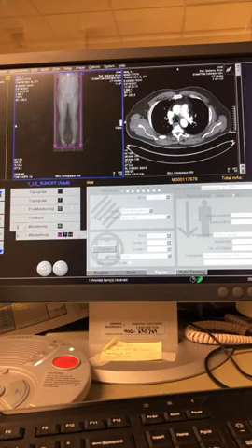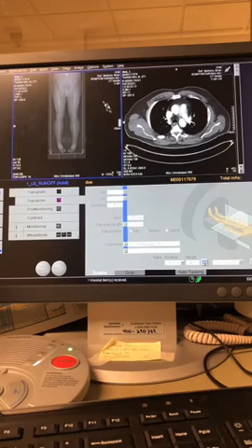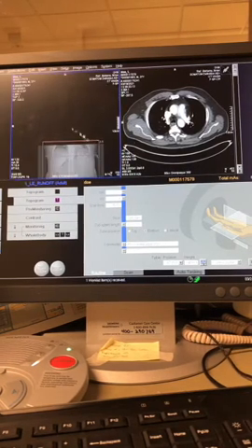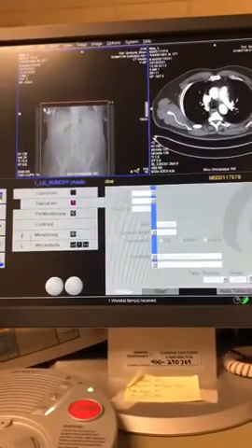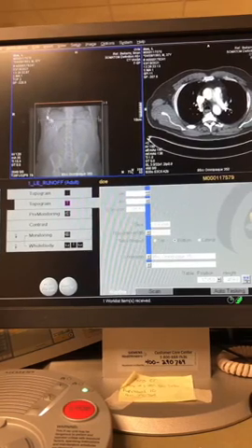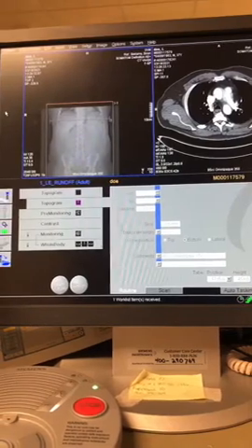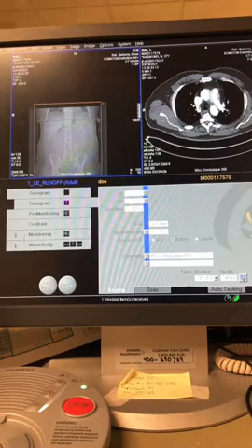All right, so again, we'll start at the top of the topogram. Now this topogram is wrong, but we'll still start there, okay? Like imagine it was a chest. I'm gonna rig it up and see if I can make it look like that. I can't. So they started at the abdomen, like they would for an abdomen. Typically you're gonna do just like a chest like we did last time, right? And we're gonna bolus track in the carina, just like we did for all the other chests. But I pulled up this protocol because it's got some specifics on it. But anyway, we would bolus track up here at the carina.